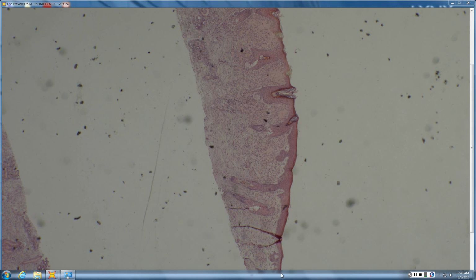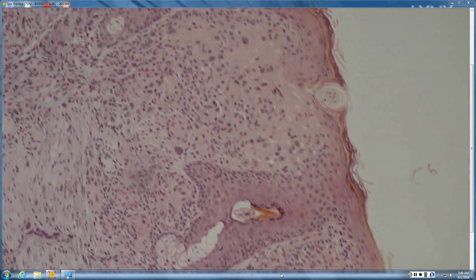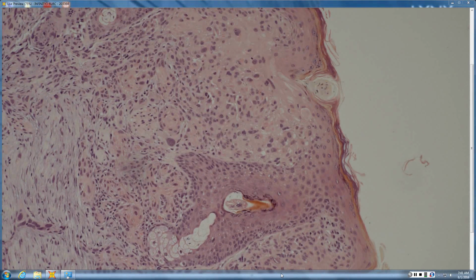Okay, James. Yes, sir. I would call it like invasive squame. So why would you call this invasive squame? There are large atypical keratinocytes without a well-maintained DEJ.